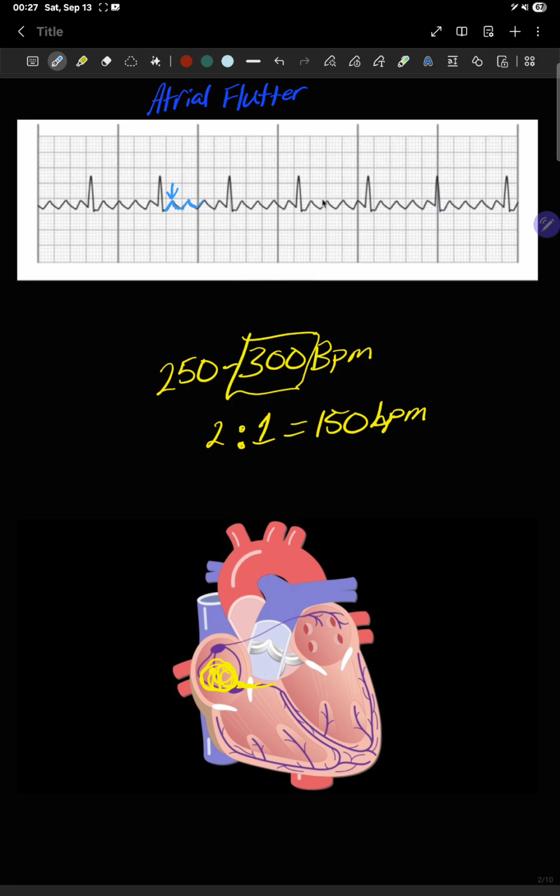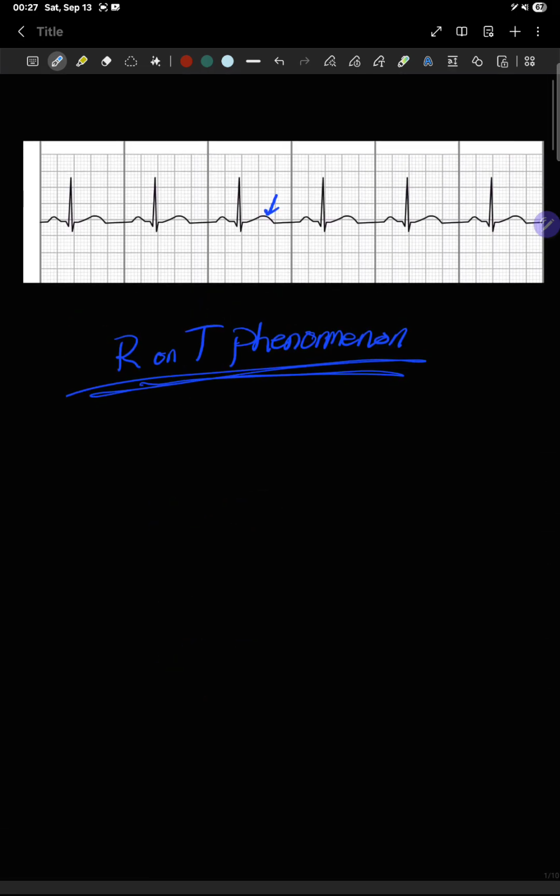Nice saw blade teeth right there. Now if we go up, look at our P wave over here. Rounded. There's no sharpness. While the other one down there is like this. See? It looks like a teepee compared to a rounded.